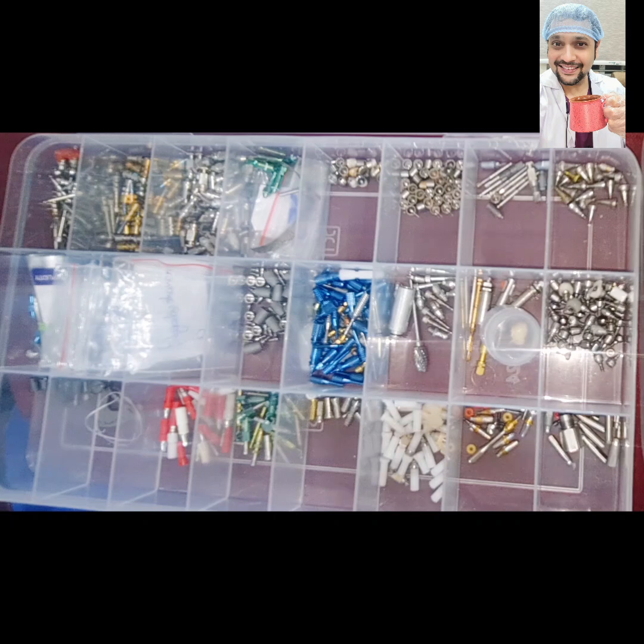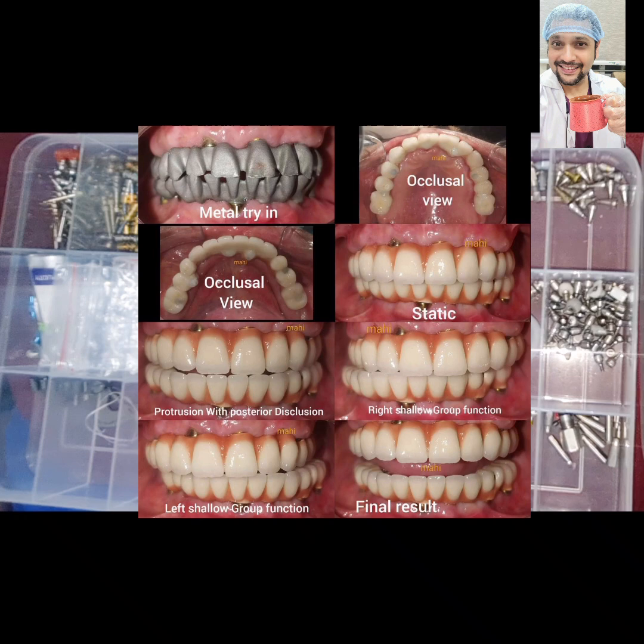On the MUA level, usually we use multi-unit abutments only for 4 implants or more. Lesser than that, we usually do not prefer. It becomes a compromised case, and then we manage with occlusion. But when it comes to 4 or more, it is good to go for a multi-unit abutment prosthesis. So when I'm using 4 implants and 4 MUAs, you get a framework usually. The framework comes over the multi-unit abutments, which is layered with ceramic, or the framework on which the superstructure is luted on. So there are different frameworks and different layerings, different superstructures that you can go with.